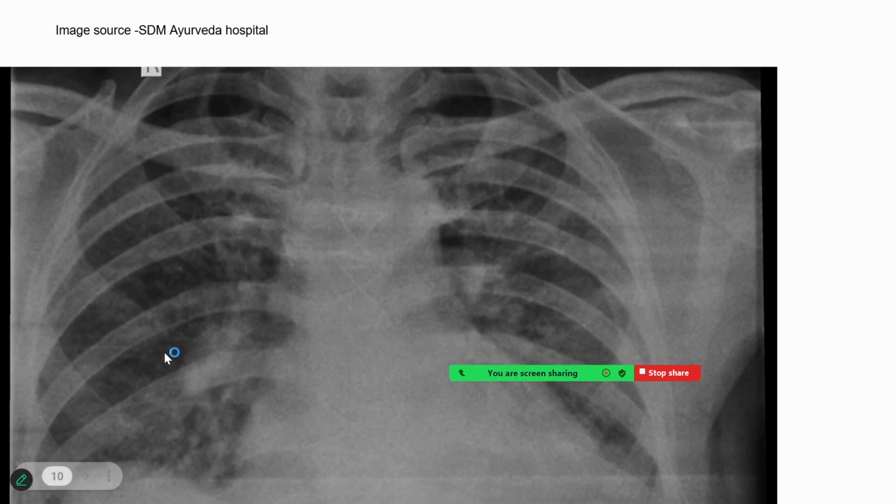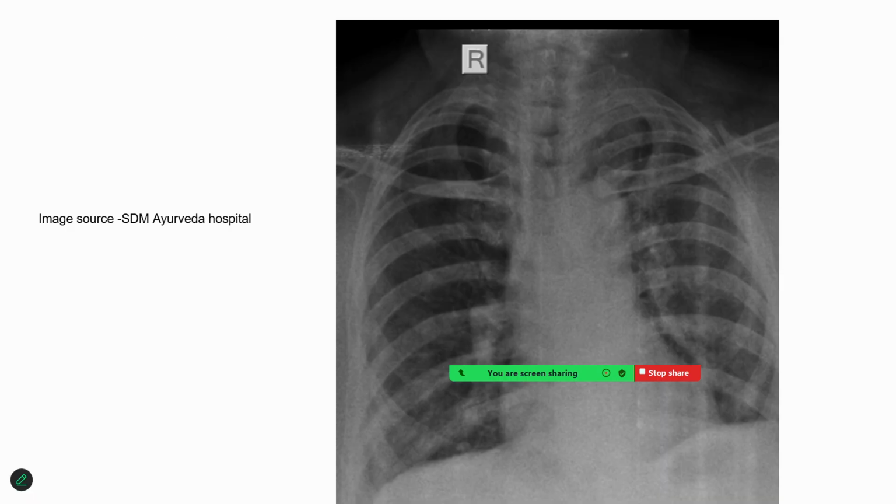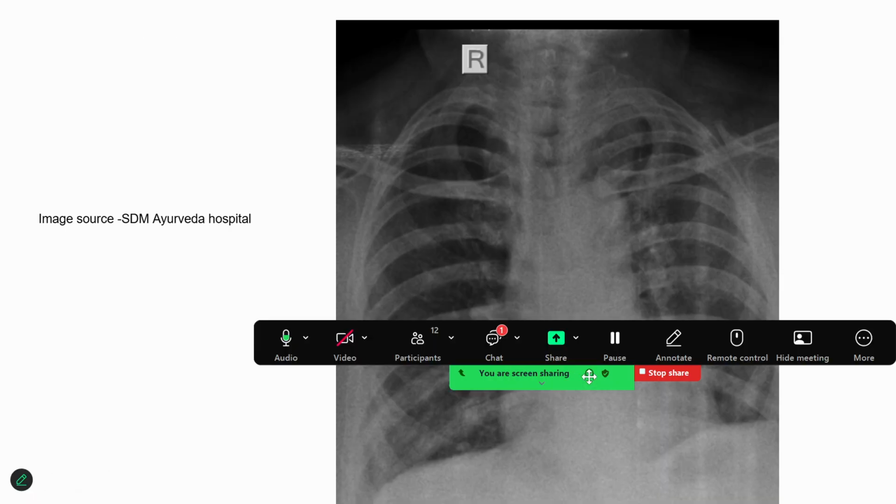And now, this is purely my consideration, I would consider these, where you have more widespread fluid collection in the alveoli and the opacity is more, as grade 2 bronchitis, where the condition becomes more severe, and the expectoration becomes more. Clinical symptoms of fever also would be increased. So that's another example.